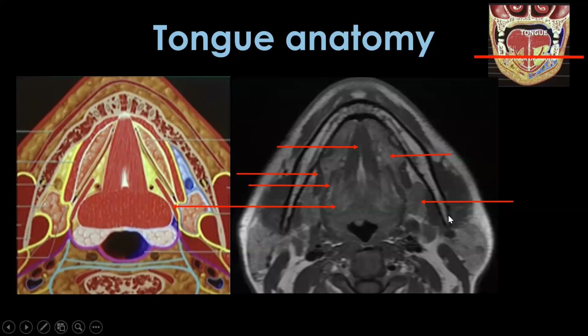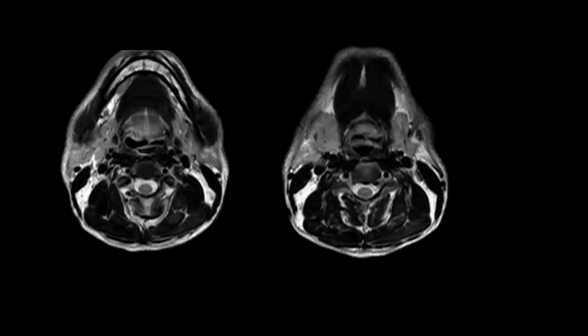One more point to note is the marrow. On T1 weighted images, any marrow in any bone will appear hyperintense. So T1 images are the best to see marrow involvement. Whenever we are thinking that there is some marrow invasion, we can go back to the primary T1. It will give us the exact extent of the marrow involvement, because a contrast image or a STIR image might show additional edema also, and we may overestimate the involvement.